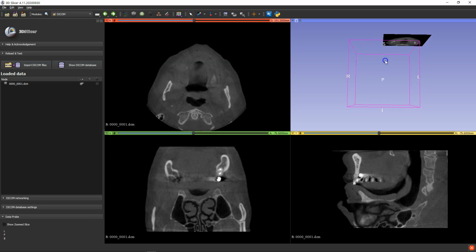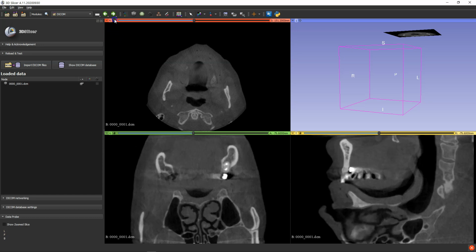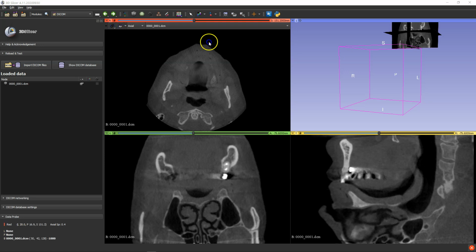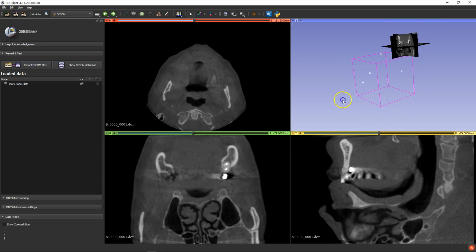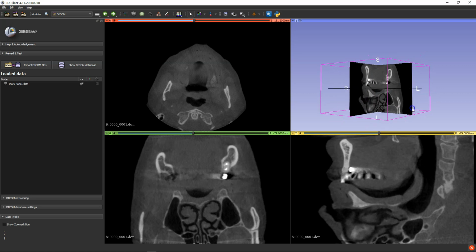But in order to get all three in one go, click on this link icon, close the eye and open it again. So close it and open it like that. Now we've got all three in the scene, but we want to move these into the center of the cube. So click on this icon over here. Okay. Now that we've got this visible, we can proceed in flipping this over by 180 degrees.